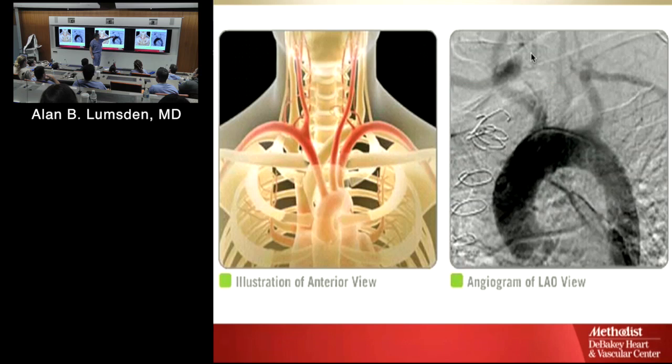Rapid fire. I don't want to make it too easy. Let's go off this. What's that? You can say crappy angiogram. I'll accept that. Crappy angiogram. What's that? Left subclavian. Okay, what view is that? LAO. What degree do you think that is? 50 degrees. Okay, we'll give you that. I actually have no idea what it is.